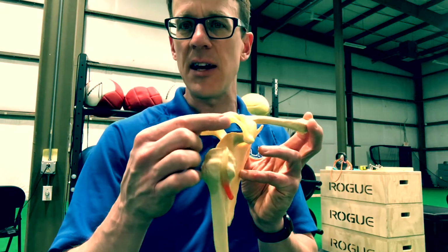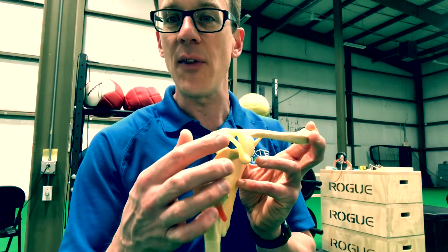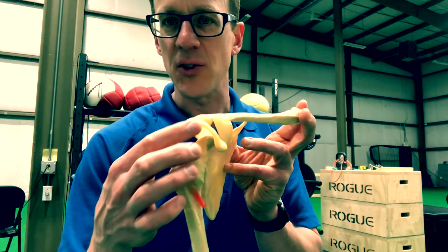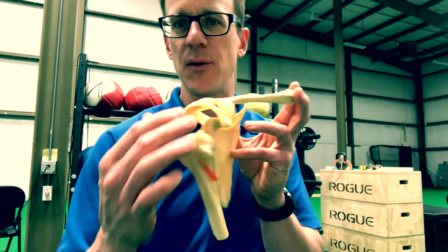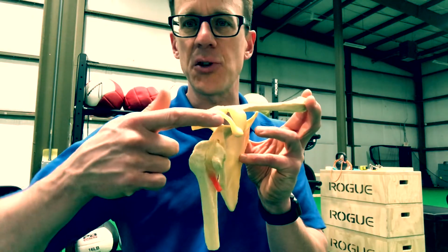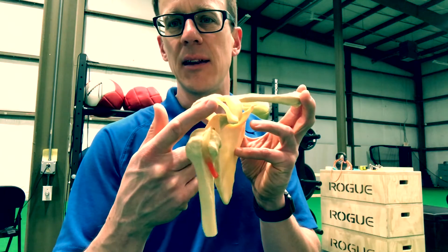So you'll see some degeneration around there. Osteophyte formation, that just means extra bone is growing around that issue right there, around your clavicle and acromion. So you'll see this bone growth, and that could create a limited space in there. So if you see that hooked acromion or osteophyte formation, it just means extra bone around this area, and you'll also see that calcification of that ligament.